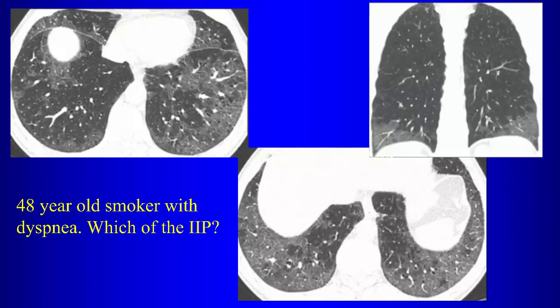The finding is... Murad, looks like you've been studying for the boards. Bilateral ground glass opacity. Yes, so we have ground glass opacities. Go ahead. In the lower lobes. Okay. Also somewhat towards the periphery, maybe. So which of the idiopathic interstitial pneumonias here in a smoker?